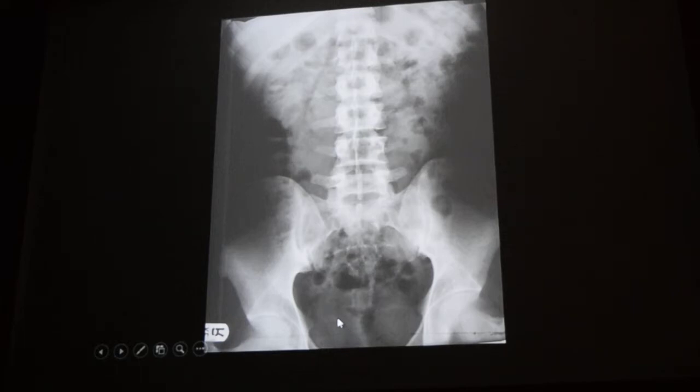So this is what I am saying. It depends on what you're looking for. You see, it looks like a lytic lesion, but in real sense it's not a lytic lesion. Why? Because you see a lot of other gas shadows like this everywhere. You see one here, one here, another one here. Obviously this one isn't a lytic lesion, there's no bone here, and there is no bone between the ribs, so it cannot be a lytic lesion. Okay?